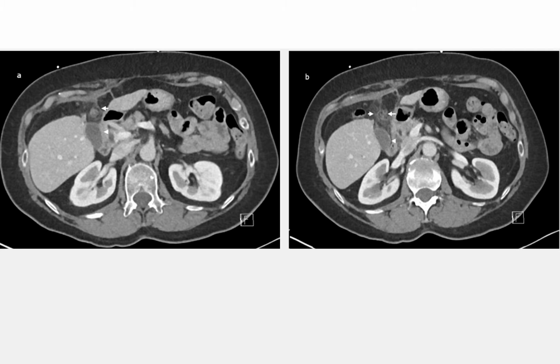Interestingly, on the CT scan, the liver looked pretty normal. The hepatic adenoma is not really well seen on the CT, and the gallbladder looked normal. Other abdominal structures looked normal, but we noticed that there was some inflammatory changes and swirling around the umbilical vein and fat stranding about the falciform ligament.